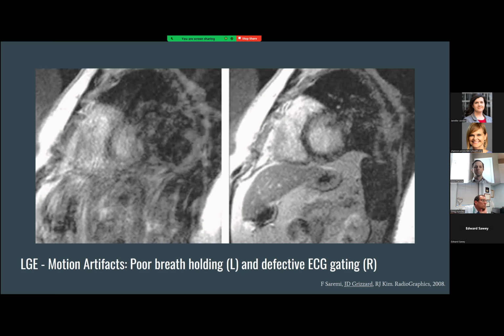You can also run into a case where if you're imaging with only the anterior coil elements, that could allow you to have a smaller field of view, produce some wrap artifact. So if you also want to decrease the breath hold duration, you could increase the number of K-space lines acquired per cardiac cycle.